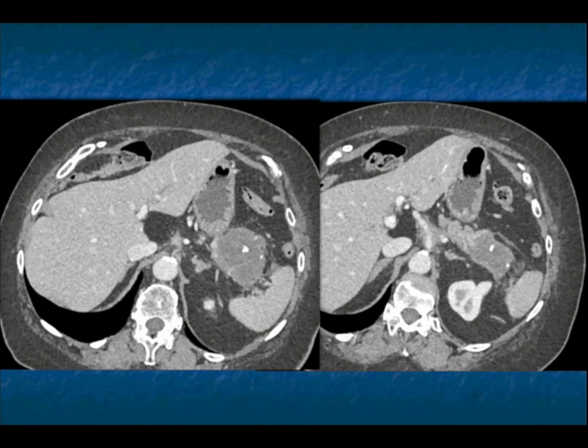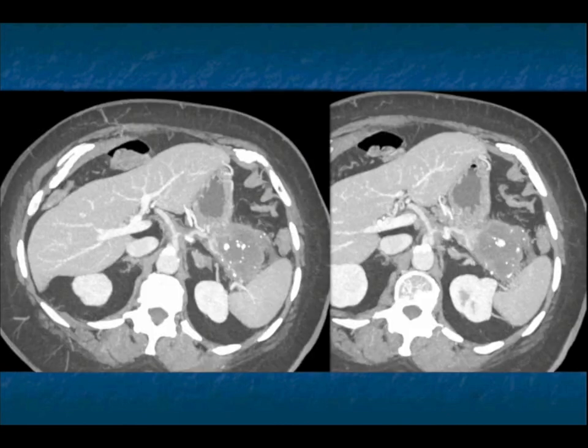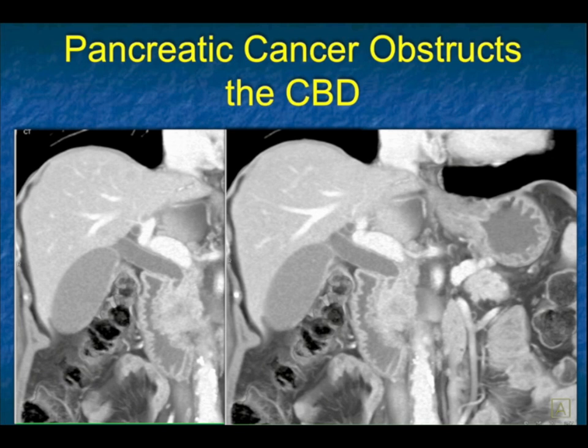Calcifications, I think about neuroendocrine tumors. We gave a talk recently on SPEN tumors, but pancreatic adenocarcinoma, although not classic, can have calcifications, but it's often because the calcifications predated the patient's tumor. And here it is with MIP really showing you the mass, the infiltration, and the calcification.